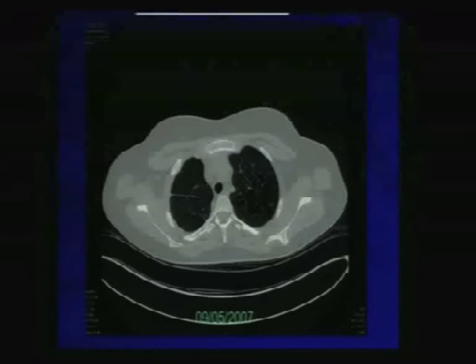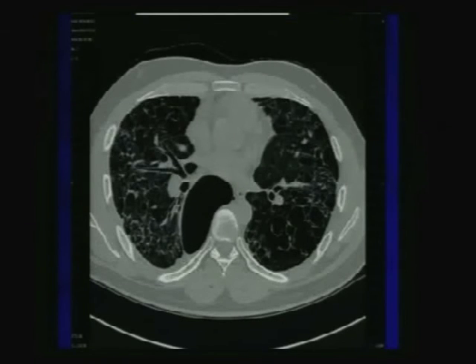This is a patient. Can anybody tell me what this disease is? So the cysts have this bizarre appearance. So this is Langerhans cell histiocytosis. Again, diffuse disease, you may have some nodular disease, but again, look how it contrasts with a patient with LAM, or especially with a patient with pulmonary emphysema. Here's another patient with Langerhans.